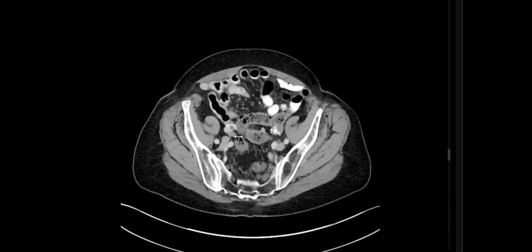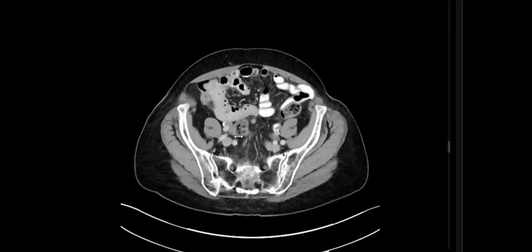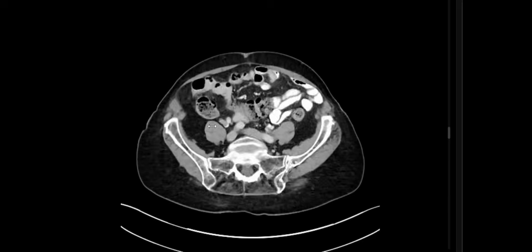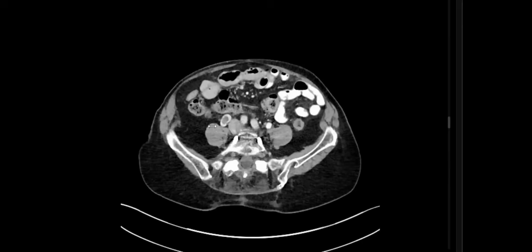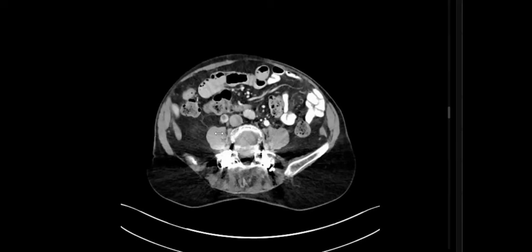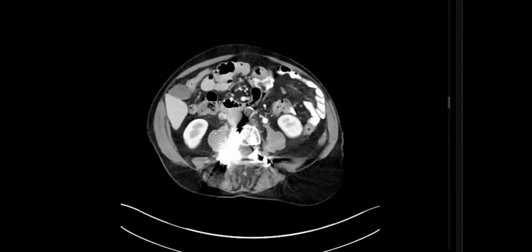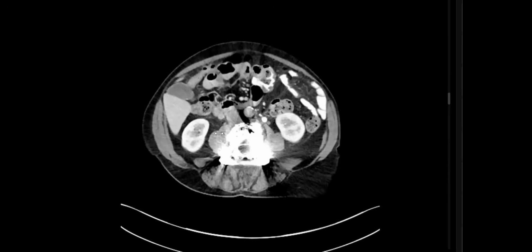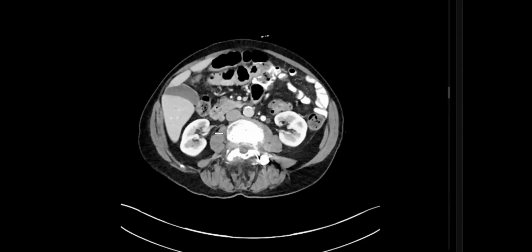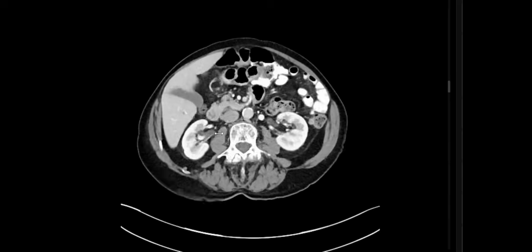Yes, go up. Because ovarian veins or gonadal veins are formed of 2 or 3 trunks. You see here, it's 2 or 3 trunks joining each other. So take care about this point. Ovarian and gonadal, testicular, whatever, okay, formed of multiple trunks. On the right side, where does it drain? On the right side, it drains directly into the IVC, while on the left side, it drains into the left renal vein. Can you show me the left side?